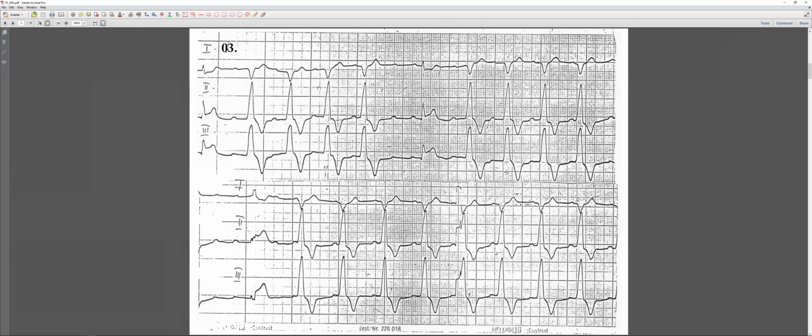Then the axis. To go back to the heart rate, how would you calculate it if it's not rhythmic? I would take an average of the number of R's in, for example, 2 seconds. Not 2 seconds, at least 4, 5, or 6 seconds. Every 5 big squares is 1 second, so there's approximately 1 R in every second. So I would say 4 R's in 4 seconds.